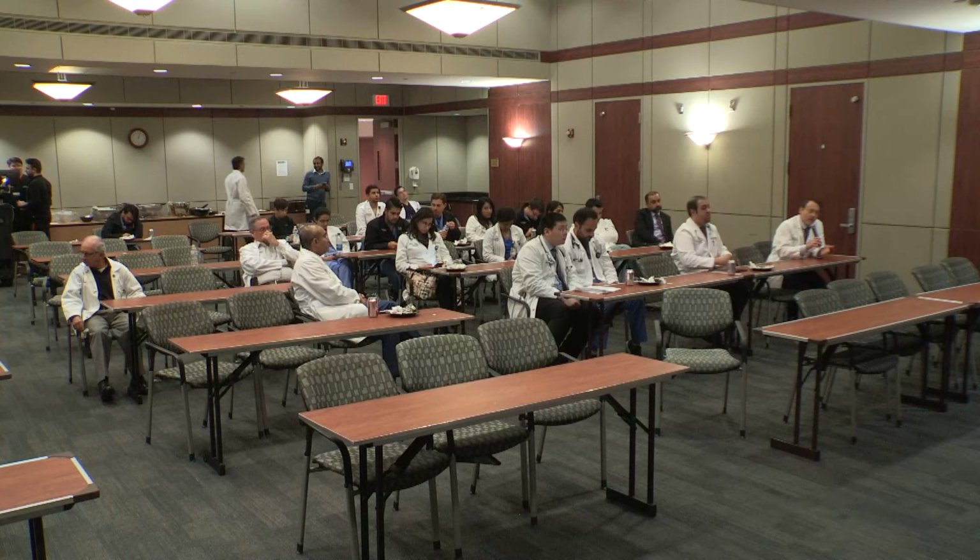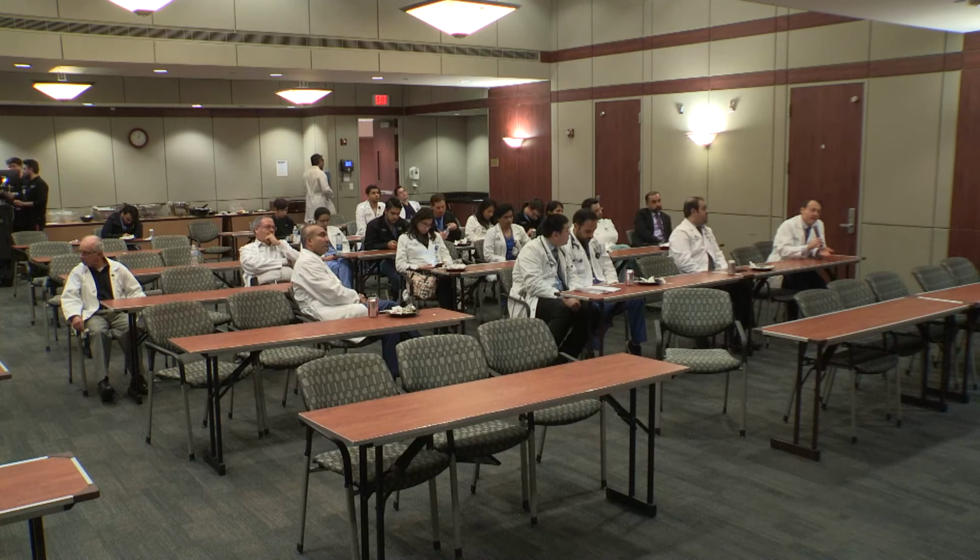So you would recommend it at least once after the LVAD is implanted? Yeah, so what we do is that we do hemodynamics and we do echoes, and then we do CT at the same time. So this way we have better information of the concomitant anatomical as well as echo information and hemodynamic information.